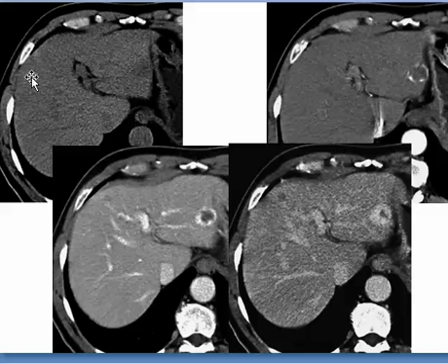But let us say this area appears a little bit abnormal in density, and in early arterial it starts to show here, but in this one it rapidly washes out in delayed scans. So it is a lesion with abnormal density which rapidly enhances and rapidly washes out, and this is an example for carcinoma.